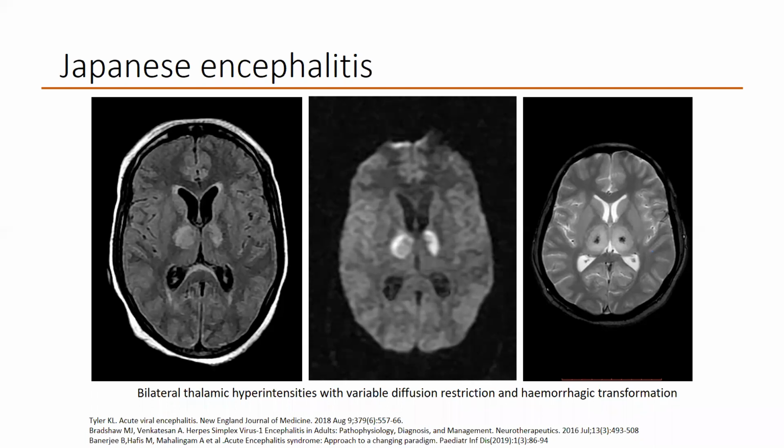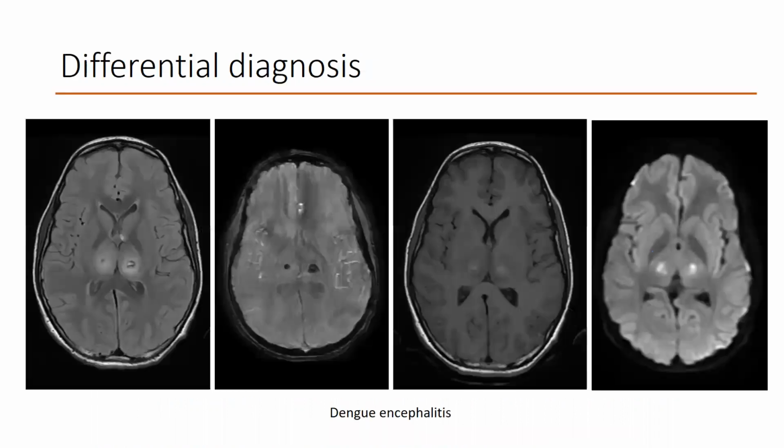Can you tell me some differential diagnosis? So you already said the medial thalamic involvement in artery of Percheron infarct. Can you tell me some other DDs of a similar presentation where the patient has bilateral thalamic involvement? So one is thrombosis of the deep venous system. Okay. Then, sir, among the viral infections, even dengue encephalitis and influenza encephalitis can also lead to similar pictures. Very good.